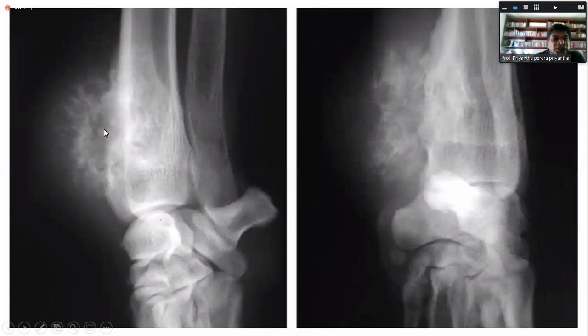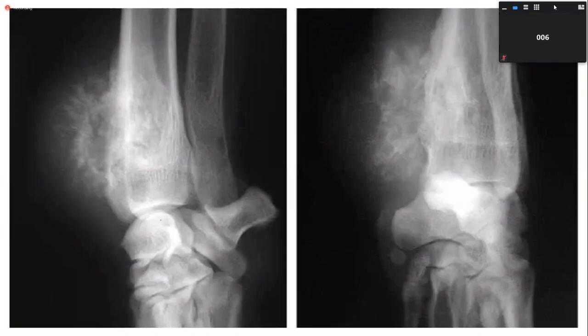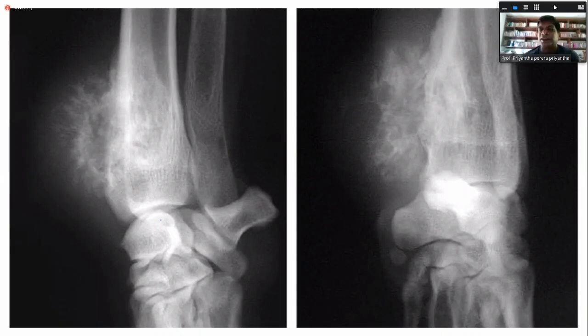So this is osteosarcoma. It's common to have children complaining of joint pains, right? Especially around 7 to 8 years, they complain of joint pains, and most of them have no problem, no abnormality. Even if you investigate or take X-rays, you can't find any abnormality, and they are generally called what? Growth pains. They are generally labeled as growth pains.